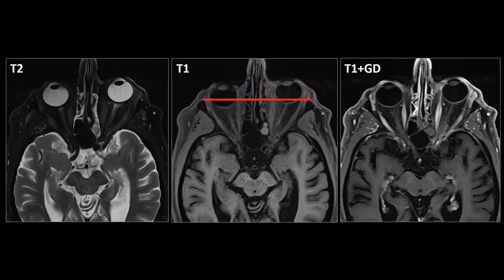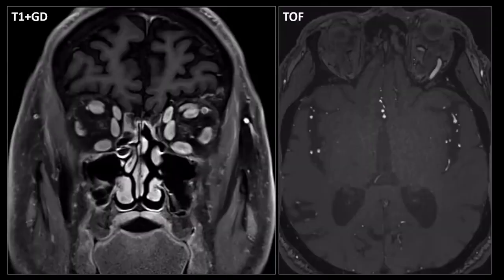The only thing we see, and it's quite subtle, I must say, if you look at the T1-weighted images, you see I drew a line there, the interzygomatic line, and there is a slight proptosis of the left eye. And then if we magnify this region a little bit, we see some enhancement. And these look like very linear structures, could be vascular. Are these vascular structures? Well, yes, they are.